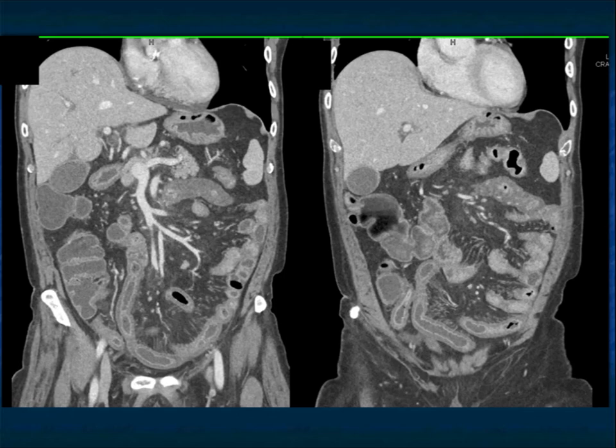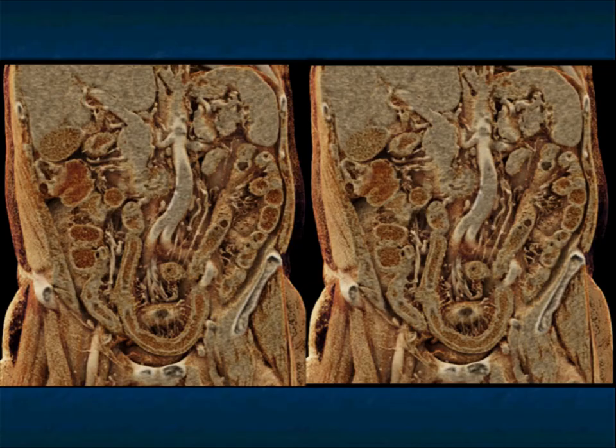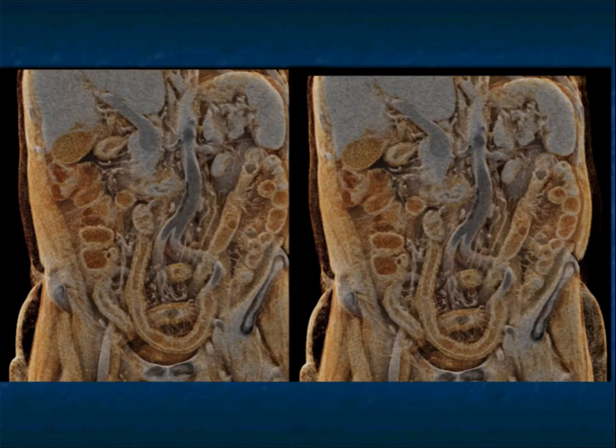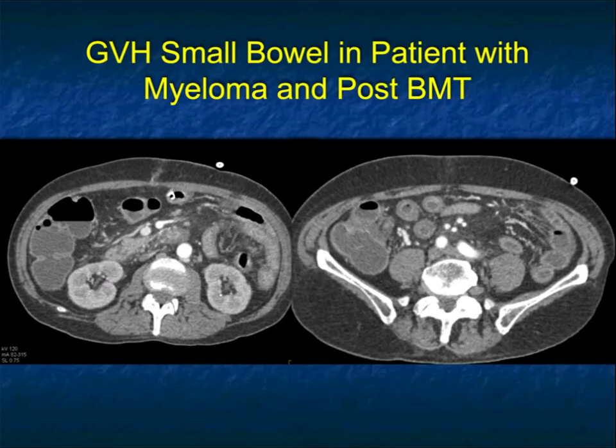So I'm thinking of something that affects the small bowel, very extensive involvement, very long length, but the vessels look good. So where am I going with this? Again, the cinematic nicely shows you the edema in the bowel wall, the extensive involvement, the prominent vessels, but still, what's the diagnosis? What am I specifically looking at? Again, very extensive involvement. So I'll look at the chart, I'll see what is going on in this patient.